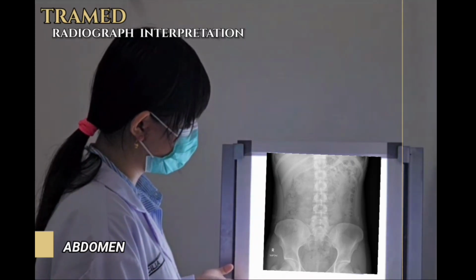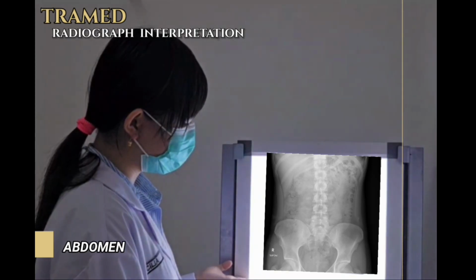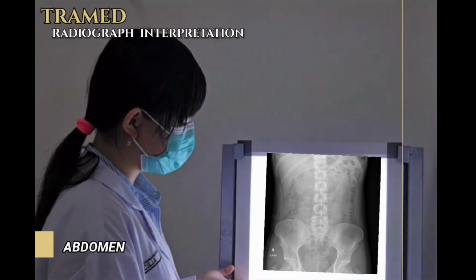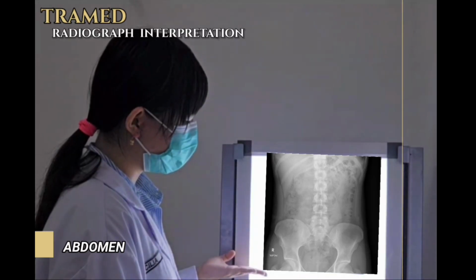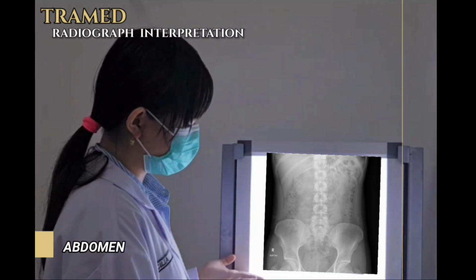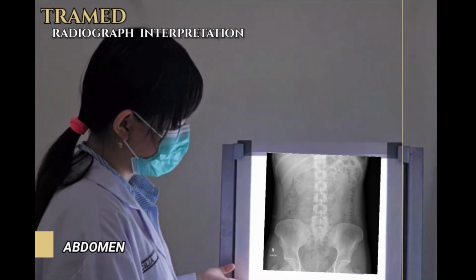And for signs of bowel dilation or wall thickening, the free extraluminal air is absent. The soft tissue masses are absent. The radio-opaque calcification along the urinary tract is absent, and the bones are intact, so it's normal.